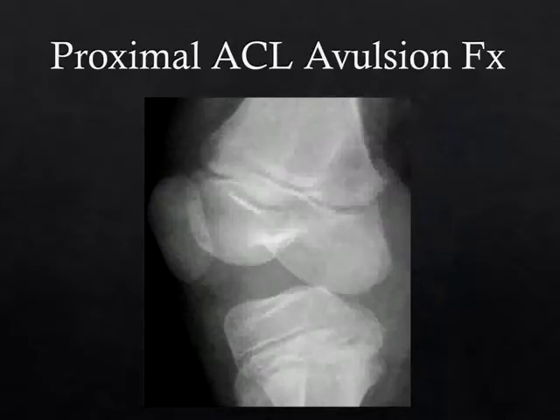They require sort of a strange mechanism. This was a 6-year-old girl who was not happy while getting this x-ray. So this is supposed to be a lateral knee. In kids, we kind of take what we can get. In this case, it worked out actually for our benefit, because you can see a small osseous fragment in the notch there. Hard to know exactly where that's coming from on the basis of this radiograph.